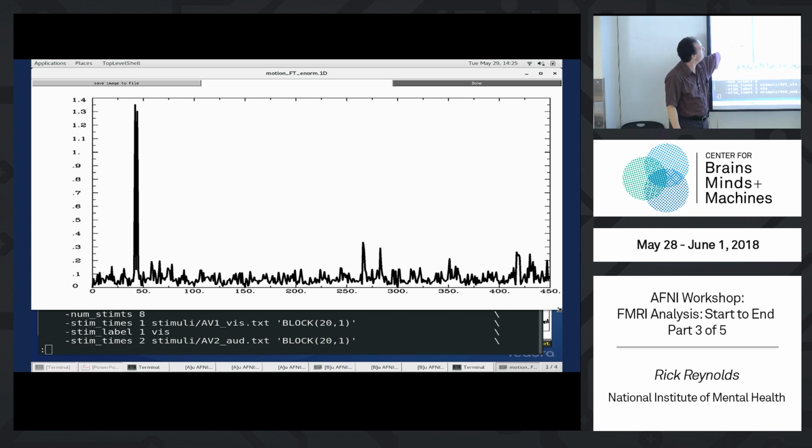You notice we have 2 spikes here. Wasn't there just one motion? Why do we have 2 spikes? That's right. It is actually 2 movements. They moved down and back up. It was 2 motions because just one volume was out of place, but that means they had to have come back to the original location. So that's your major motion right there, and then we have a couple little spikes down there.